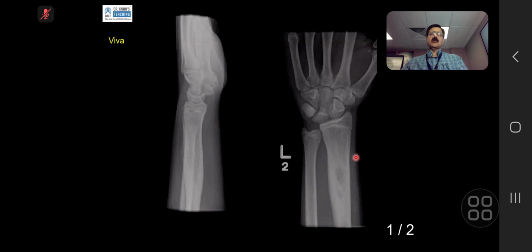Again, the candidate did well because in this age group, what are the aggressive lesions which can cause this type of finding? Ewing's is the key, top, and then, of course, LCH, you can definitely keep it in the differential. One thing I want to add is that there was a bit of periosteal reaction on the lateral.